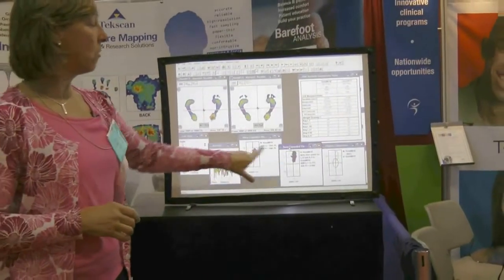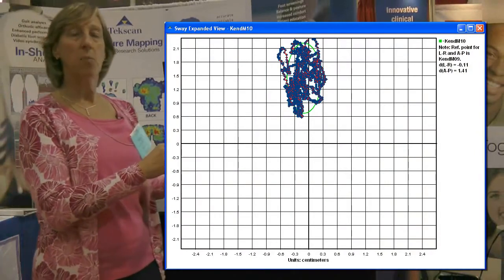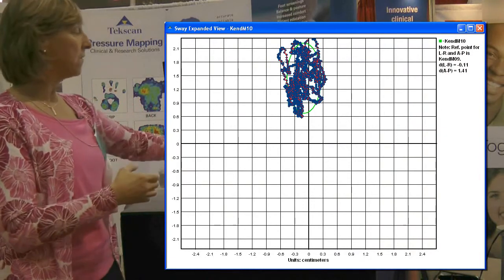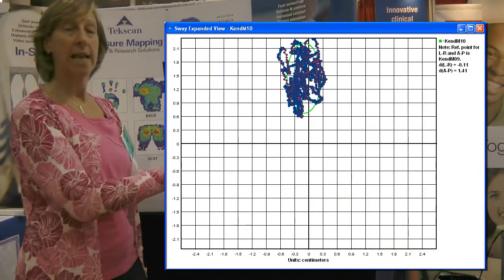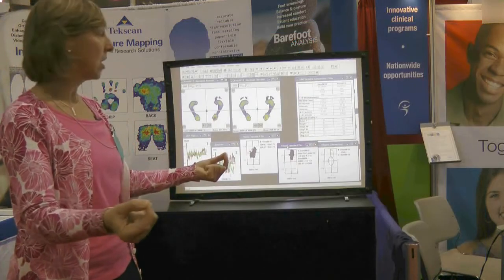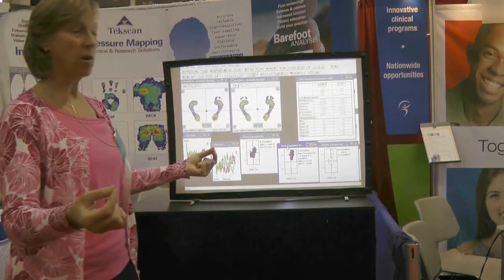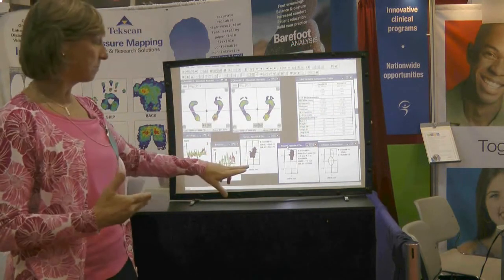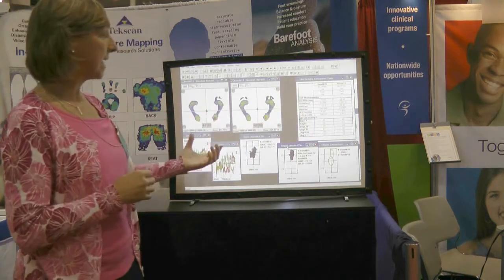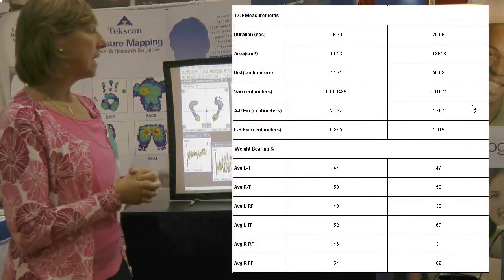Now, inside these ovals are all these dark dotted lines. These are the point-by-point data that's collected over the 30-second total acquisition. If you take all of these little points and connect them by a line, and then take that line and pull it out like a straight string, you will then have distance information of the total distance that the point has traveled. The remainder of the information that's in the table, again, is taking the qualitative information and dropping it into a table for ease.